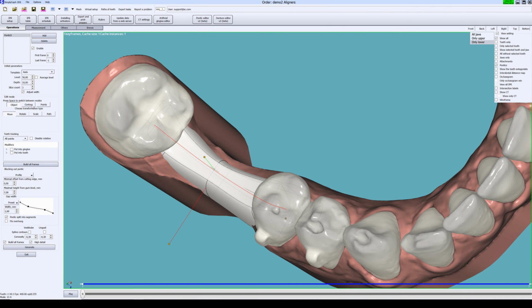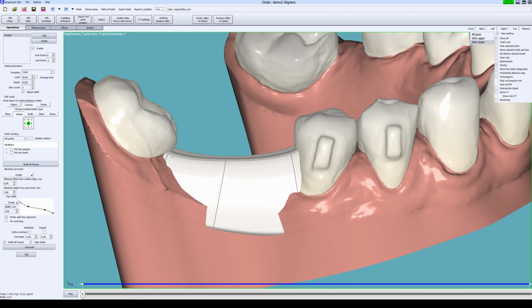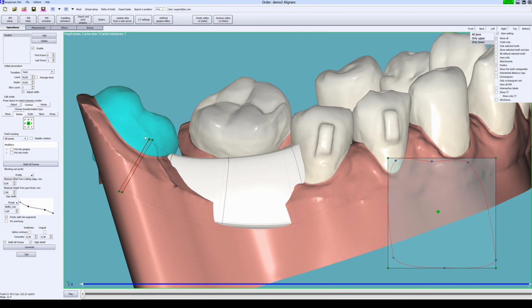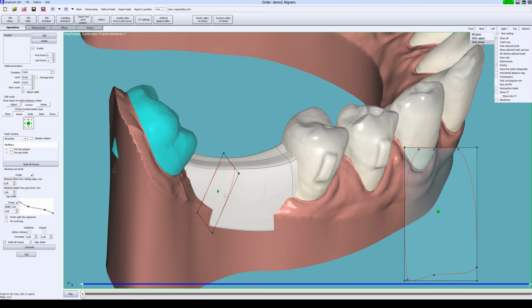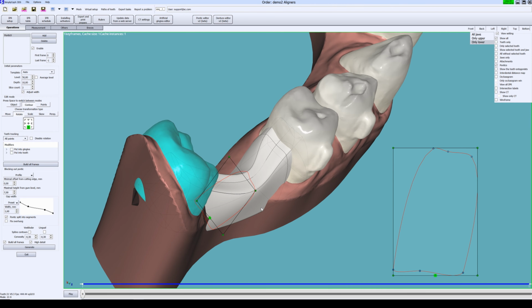The next adjusting level is contour. The pontic's model is formed from contours, and we can edit each one separately. We can rotate a contour in the additional viewport or in the general viewport. The default rotation center is the center of the contour. We can change the rotation center in the menu. Now I selected the bottom edge and you see how it works now.